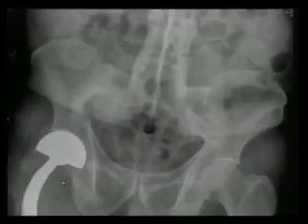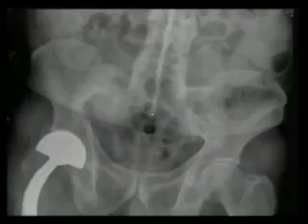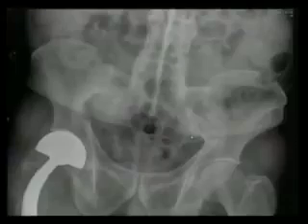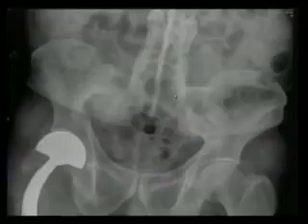What do you notice though about the bones? They are fused. Very good. What else do you notice? The SI joints are fused. What is this? Ankylosing spondylitis, absolutely. Ankylosing spondylitis will not be in your cervical spine without being in the rest of your spine and SI joints. It starts at the SI joints, they fuse, and then you get, this is called the what? Bamboo spine. The bamboo spine, ankylosing spondylitis.